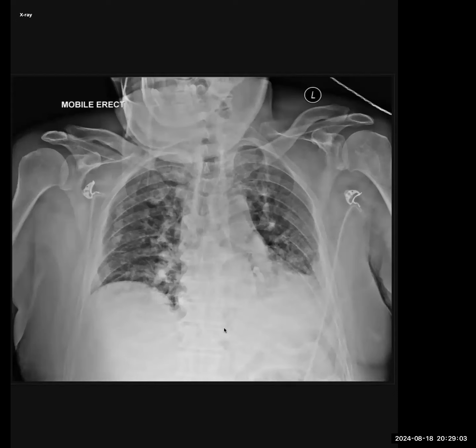Okay. So this is the frontal radiograph of an adult patient who has undergone trauma as well as cardiac arrest. I can see that bilateral lung fields show some patchy airspace opacities. The right hila also appears mildly prominent. I'm just seeing if there are any lines and tubes that I can comment upon.